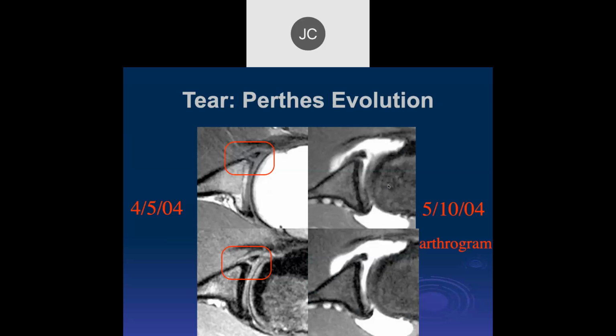Yeah, so looking at that anterior labrum, it looks kind of thickened and scarred. So this is a Perthes lesion with the periosteal attachment intact. I don't really think it's important to say whether it's a Perthes lesion or not. You treat it the same whether the periosteal attachments are intact or not. But I just want to show you here how rapidly you can get that healing effect with thickening of the tendon. This occurred in 5 weeks.